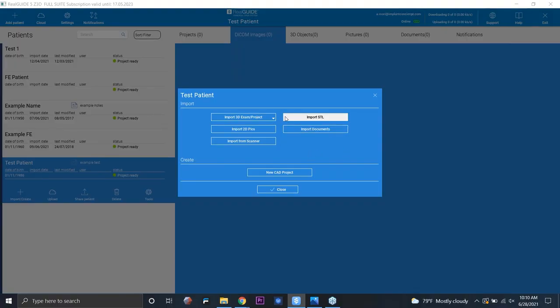So we're going to begin uploading the CT because that's, of course, going to be the number one requirement for us to treatment plan. And you can see that there's a couple of different categories, mainly just to make it convenient. If you have your CT in a zip folder, you can upload the zip directly without needing to extract it. Or, of course, if you have a regular folder, you can select that option as well.